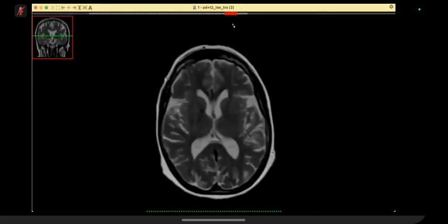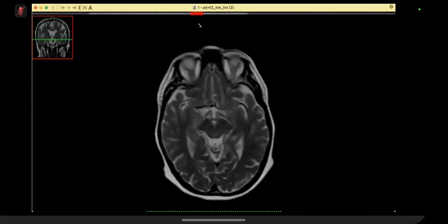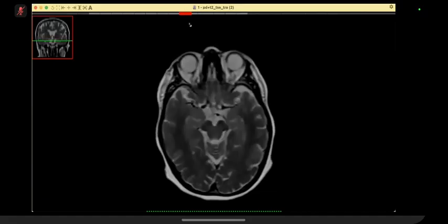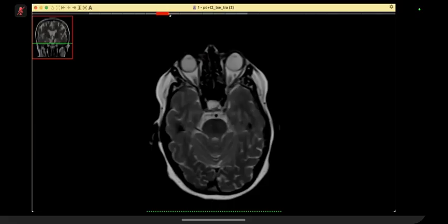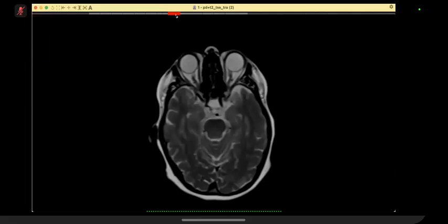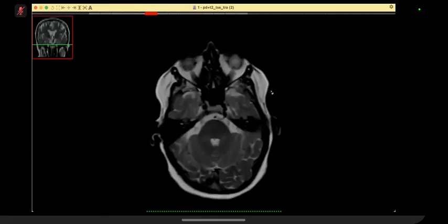So the thing that caught my eye here, yes, there is only some lag, Doctor. I need to bring it here. At the level of the, here I am in the suprasellar cistern. Let me scroll for you. Yes, this is better. So I will keep scrolling for you.